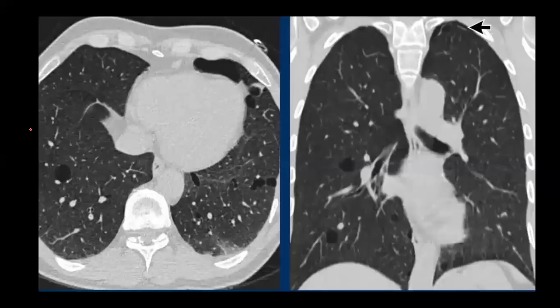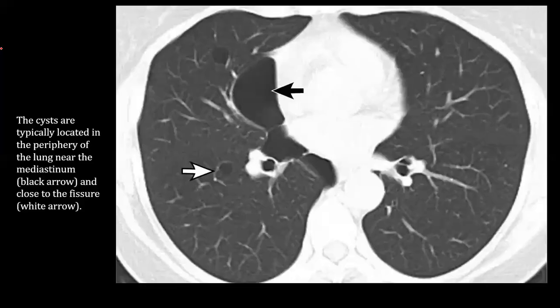So this is a BHD. Again, this is a pneumothorax and paramediastinal cyst, and also bizarre, not bizarre, in fact lentiform shaped cysts. Bizarre shaped cysts are usually seen, as previously discussed, in LCH.